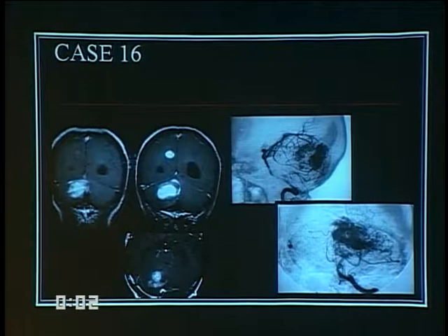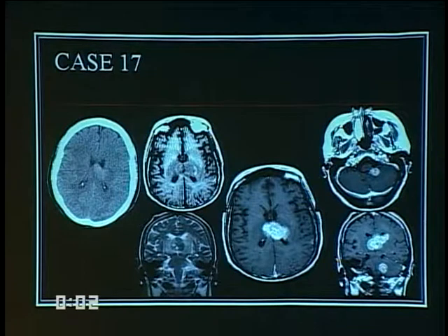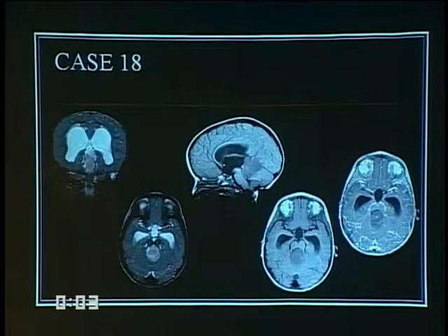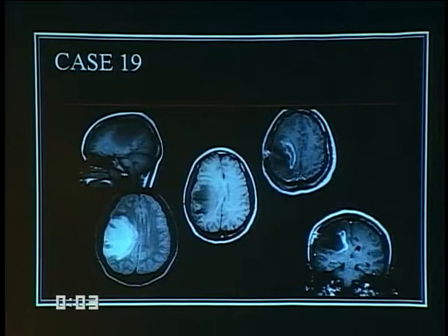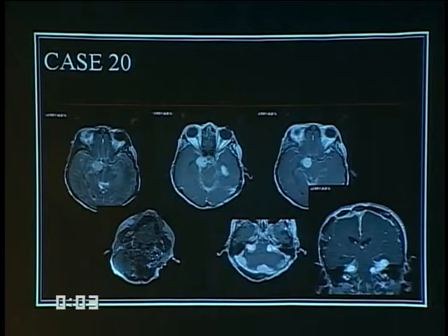And this patient has von Hippel-Lindau. This ought to look familiar as well.